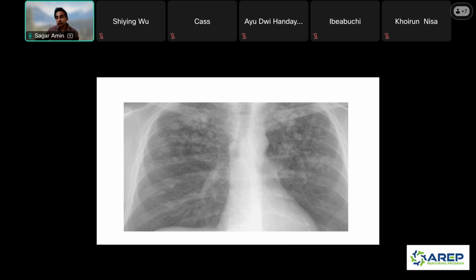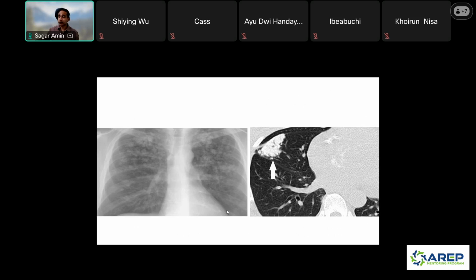So, some things I would think of would be, is it an infection? Is there some sort of inhalational process happening here? But the hyperdense appearance of it is interesting and is unique because it's probably calcified. It's somewhere near the attenuation of the adjacent bone. So does anybody have any ideas of what this could be?